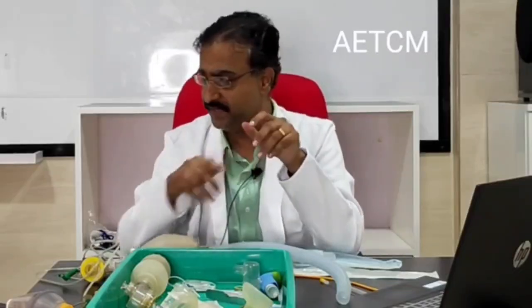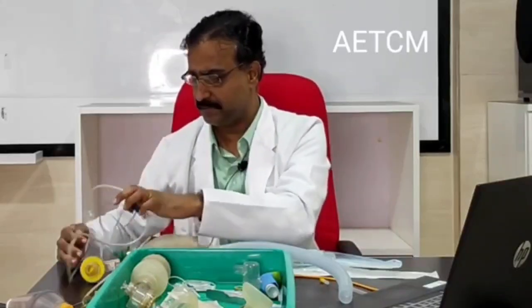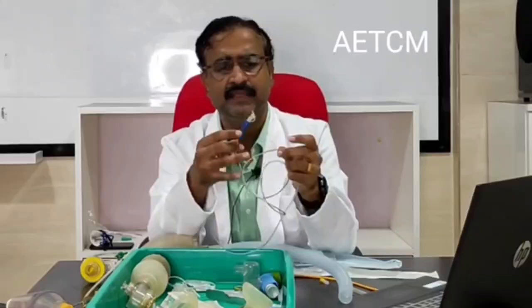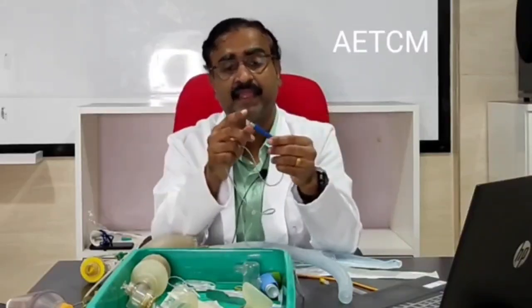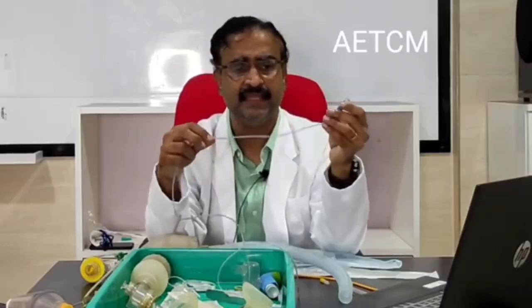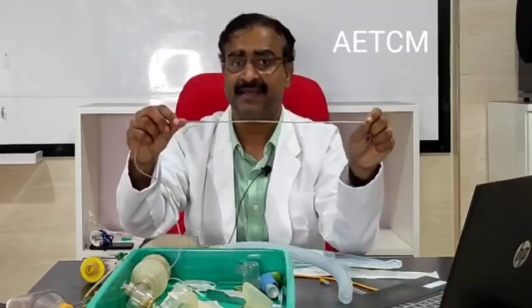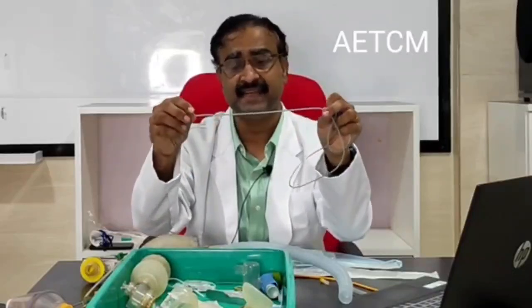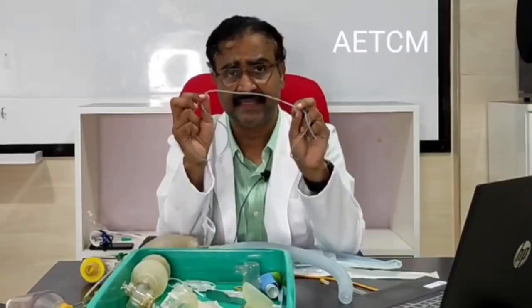Let us go to the next instrument, which is the nasogastric tube or the feeding tube or the NG feeding tube. Now, this is how a feeding tube looks like. Something that forms a very unique characteristic feature is a cap on the proximal end, and the entire length of the tube has got a lead line. A blue or a green or a black lead line goes across the entire length of the tube. There is a reason for that. This is a lead line and this is radio opaque.